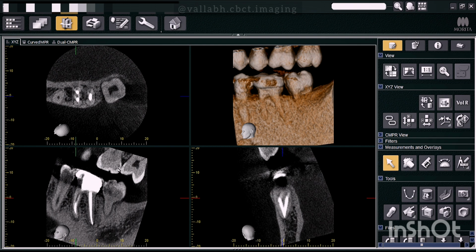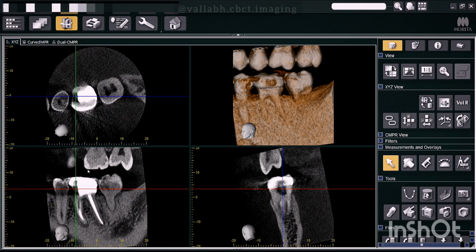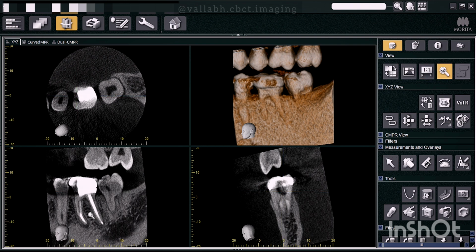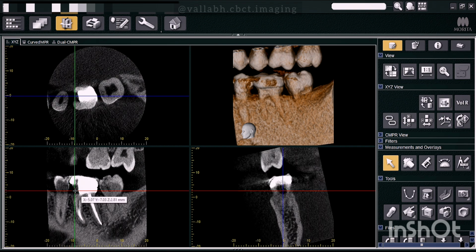However, what could be the reason for the pain? So one reason could be that there is a chance of loss of tooth structure beneath the restoration. This is the restoration. However, this needs clinical evaluation, whether there is some kind of loss of tooth structure which has caused PDL widening in the apical one-third of the mesial root. You can also say there is interdental bone loss in this region. So there are chances of food lodgement, which is giving some kind of pain sensation to the patient.